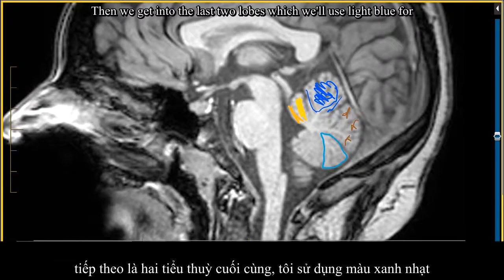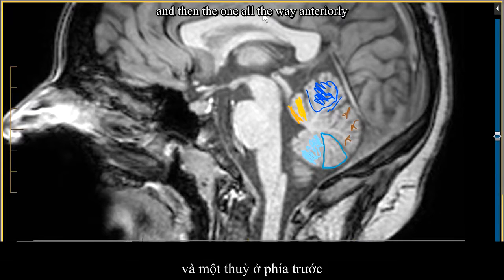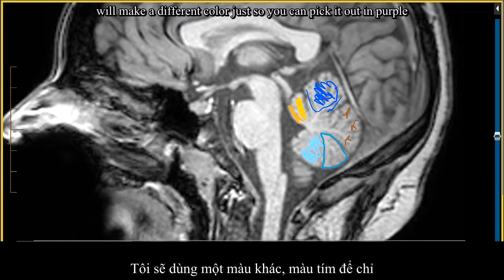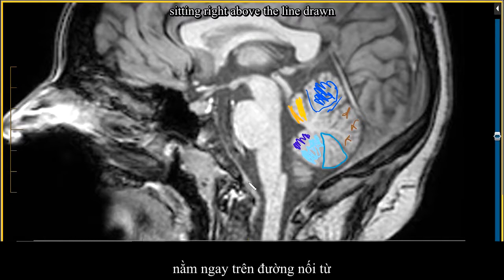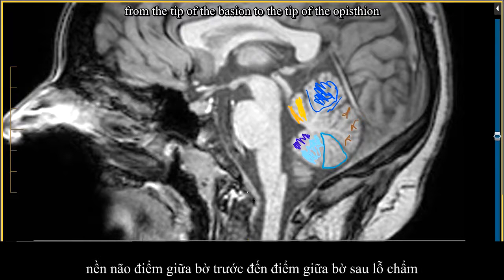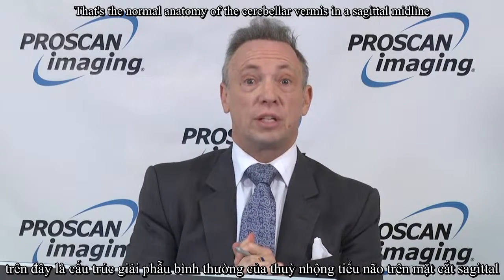And then we get into the last 2 lobes, which we'll use light blue for, the uvula, and then the one all the way anteriorly, we'll make a different color just so you can pick it out, in purple, the nodulus. And here is the tonsil of the cerebellum sitting right above the line drawn from the tip of the basion to the tip of the opisthion. That's the normal anatomy of the cerebellar vermis in the sagittal midline.